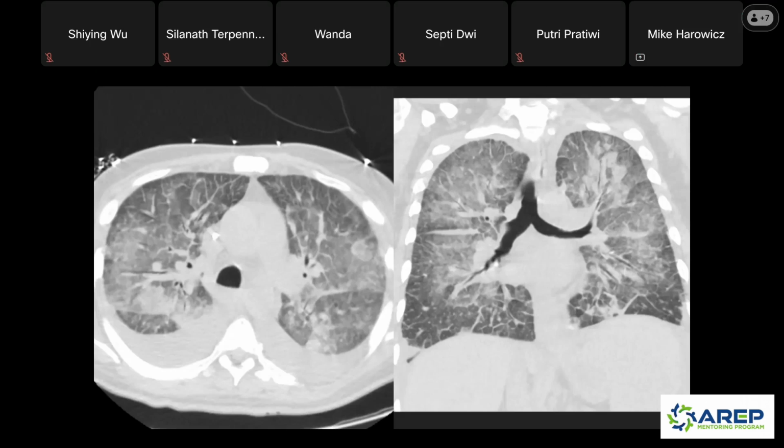So when I look at this, a couple of things really stand out to me. I mentioned all those lines that we were seeing on the chest x-ray, and I think we're seeing something very similar here on the CT. When you look at the periphery, we have an axial and a coronal CT. There are a lot of these prominent lines out here, and it's more obvious on the coronal, I think. All of these lines out in the periphery. That's interlobular septal thickening, right? That's what's going to cause those lines on the chest radiograph. So the interlobular septa are thickened.